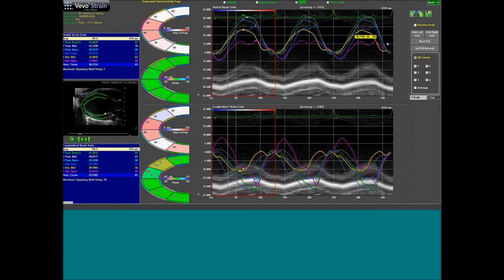these different segments. You have control over here to look at different curves, so you can add and remove different curves if you only wanted to look at certain segments. The improved analysis over here is really nice now, where, as I mentioned in the lead-in, all of these peak data here and this display is just based on this one R-to-R cycle, and you can see the red window here. So we can actually skip around to different cycles in the analysis.